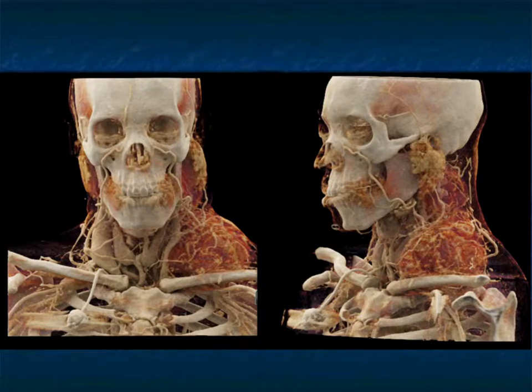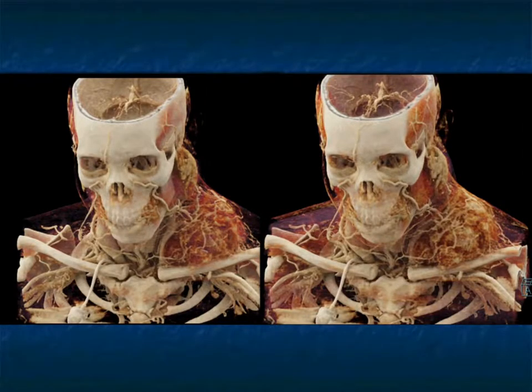Now, patients with lymphoma will be treated by chemotherapy, but this gives you a feel of how we can use the information if we were constructing radiation ports, if we were doing surgery or planning biopsy. All of this information really gives you a really good feel, not just that there's tumor present, but the orientation of the tumor and positioning of the tumor.